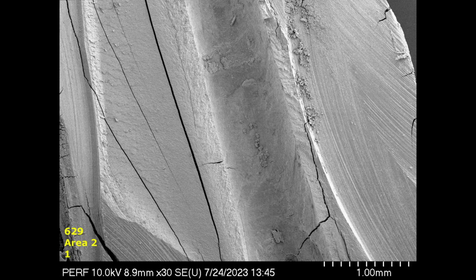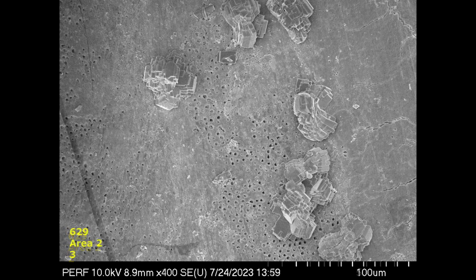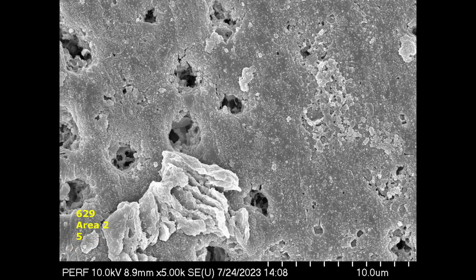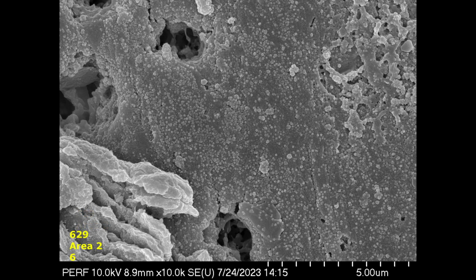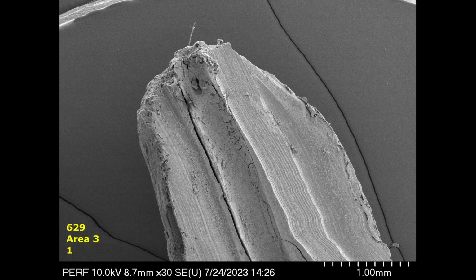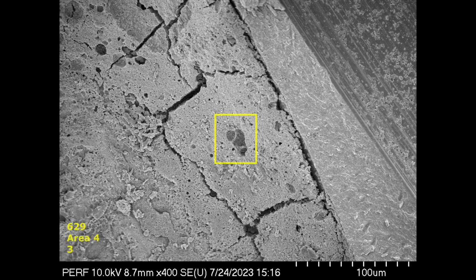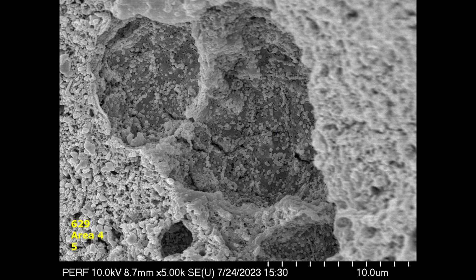In area 2, you can see how the demineralization of the predentin structure creates layered remnants of dentin, reminiscent of the plate-like structure as dentin is mineralized originally. In area 3, there is one area particularly interesting to those interested in learning how to distinguish biofilms from demineralizing dentin. Although most of this is sealer, there are areas of exposed naked dentinal wall.